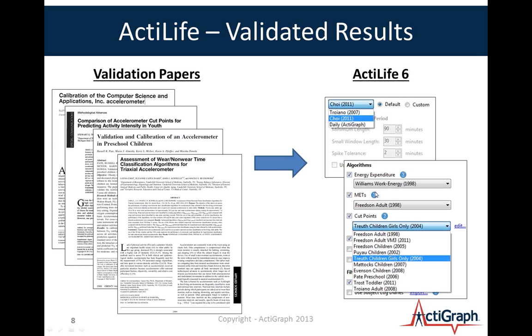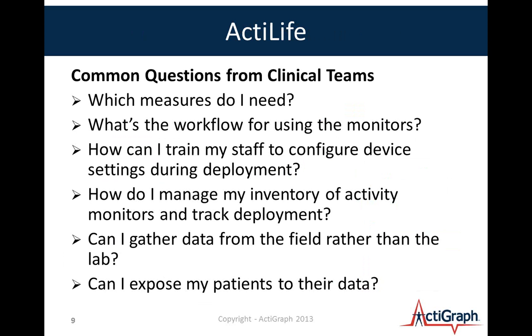And the same with all of our algorithms, so energy expenditure and METs and cut points. All of those are put into the tool, and that's the win for you as a customer, is that we've done the back-end work to sort of make it easy to use these validated outcomes and sort of leapfrog you into getting your data quickly.